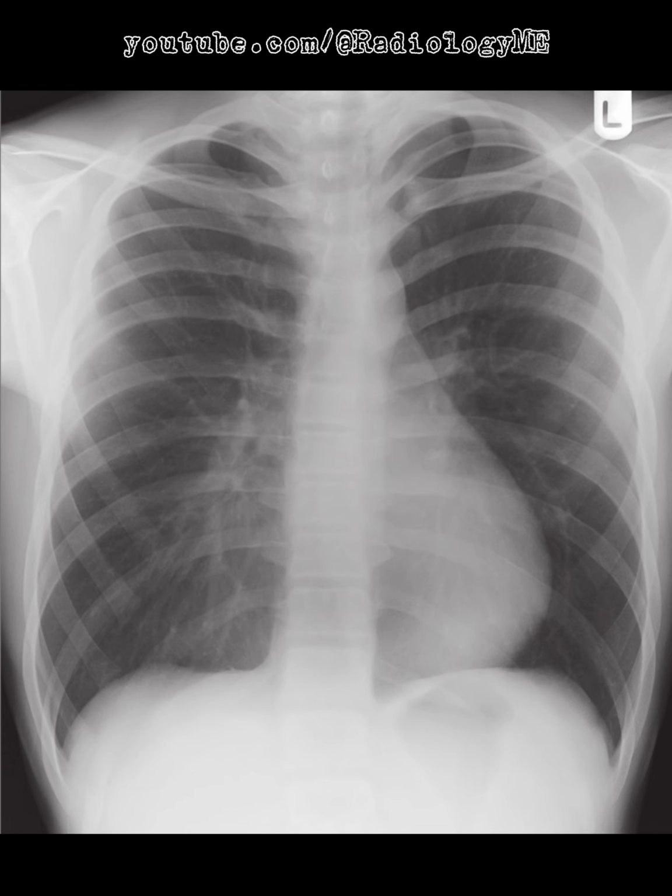Lastly, a potential follow-up question could be, what are the clinical implications of pectus excavatum? While this condition is often asymptomatic, severe cases can lead to cardiopulmonary compromise, where the compressed lungs and displaced heart might result in dyspnea, reduced exercise tolerance, or even arrhythmias. In conclusion, it looks like this patient is presenting with features highly suggestive of pectus excavatum, a structural thoracic deformity.